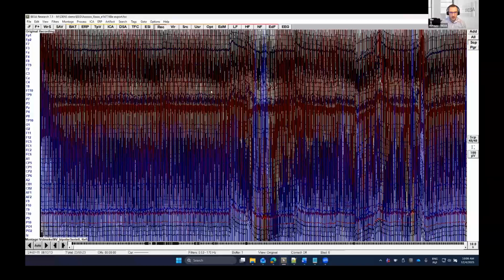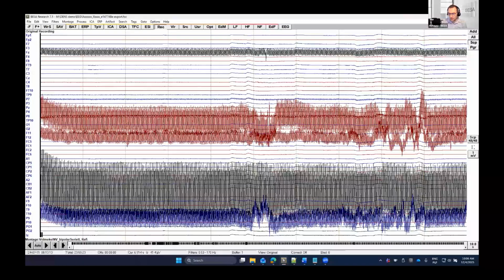So the very first thing I will do is to perform co-registration. I already did the segmentation for MRI because it's a bit time consuming. And the cool thing is that we can start the co-registration and continue analyzing the data. And once the co-registration is done, it will be automatically loaded.